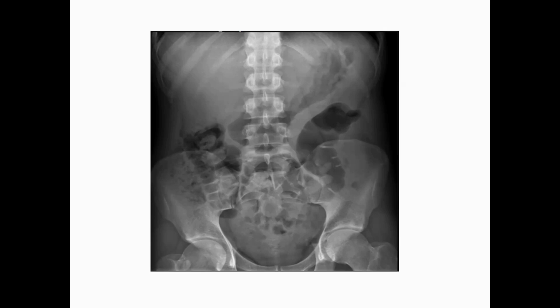We are going to discuss abdominal X-ray interpretation. First, I will go through the normal anatomical structures like the stomach, small and large bowels, and soft tissue like the spleen, kidneys, liver, and bladder. Then we're going to go to the pathology, the common acute abdominal pathology like intestinal obstruction, perforation, calcification, renal calculus, and other calcifications, along with foreign bodies.